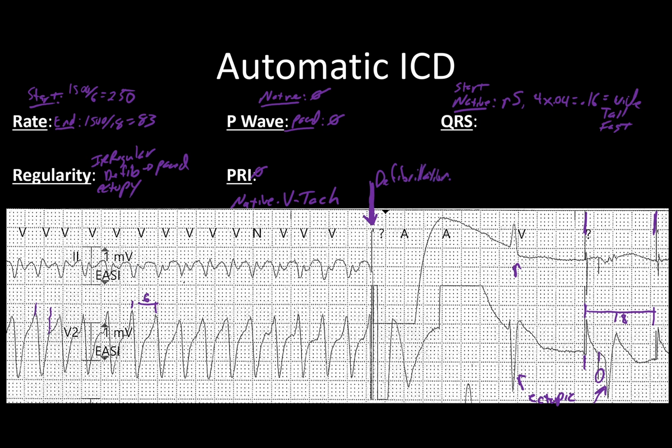The device let loose a very large electrical charge designed to completely depolarize the entirety of the heart, and that's why you see so much energy here, is that it just goes off the charts. The whole heart is shocked at once. It resets everything, which is why you have this line here where that whole heart is just kind of recovering from all of that. And then you get these native beats here. And the native beats aren't enough, and so then you have the pacer kick in afterwards.